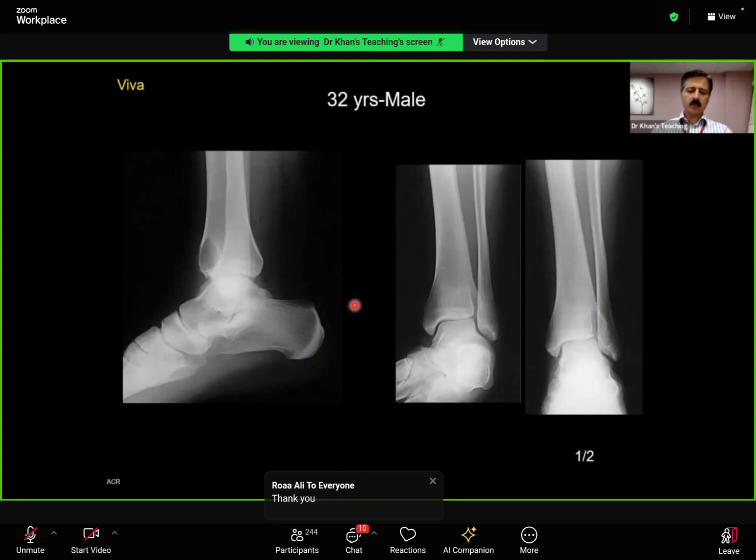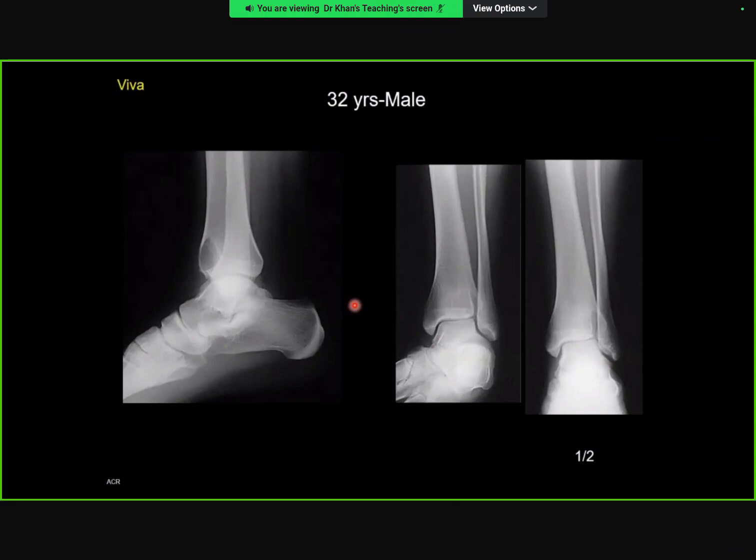Yes, please. So I've got frontal and lateral radiographs of the ankle in a skeletally mature male, and I can see a well-defined lucent lesion in the distal metaphysis of the tibia, which has a well-defined margin. There's no surrounding periosteal reaction. It does not cross into the epiphysis. It's primarily metaphyseal and eccentric in location. No soft tissue swelling, and the underlying matrix does not have any calcification within it.